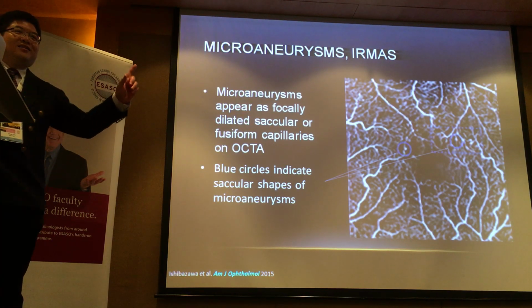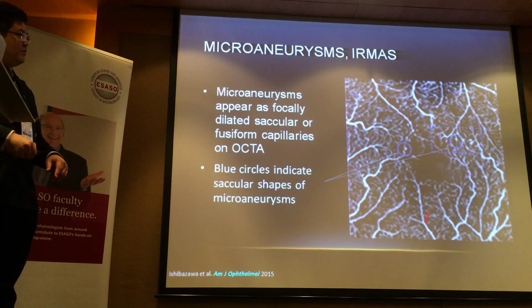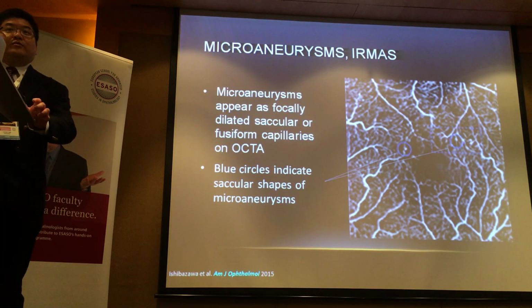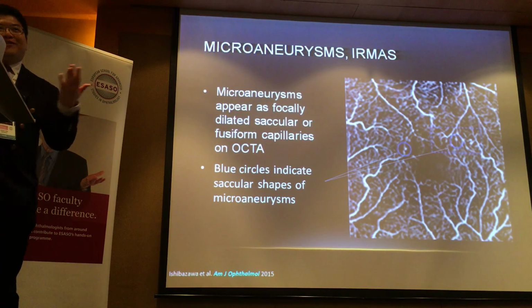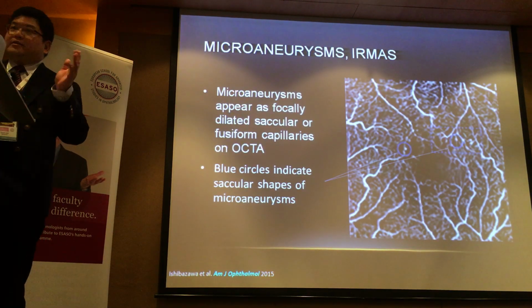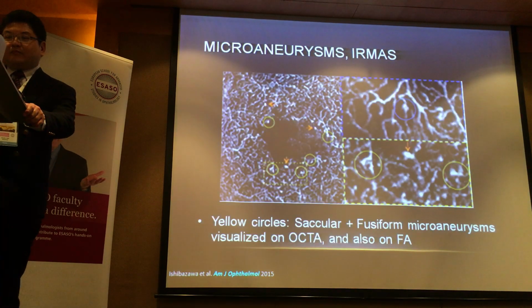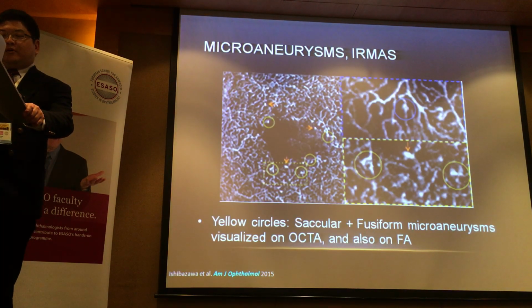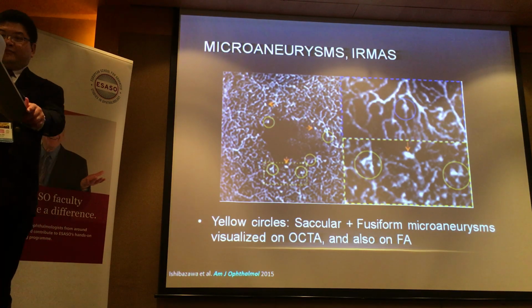But it doesn't mean that one misses out and the other takes out. It just shows some here on the FA, some there on the OCT-A, and you don't see it on the other one. So which do you believe, really? Are you going to do both and integrate them? Are you going to take one? So these are the challenges that we face right now when we talk about OCT-A. Right. So again, even more florid examples of this.